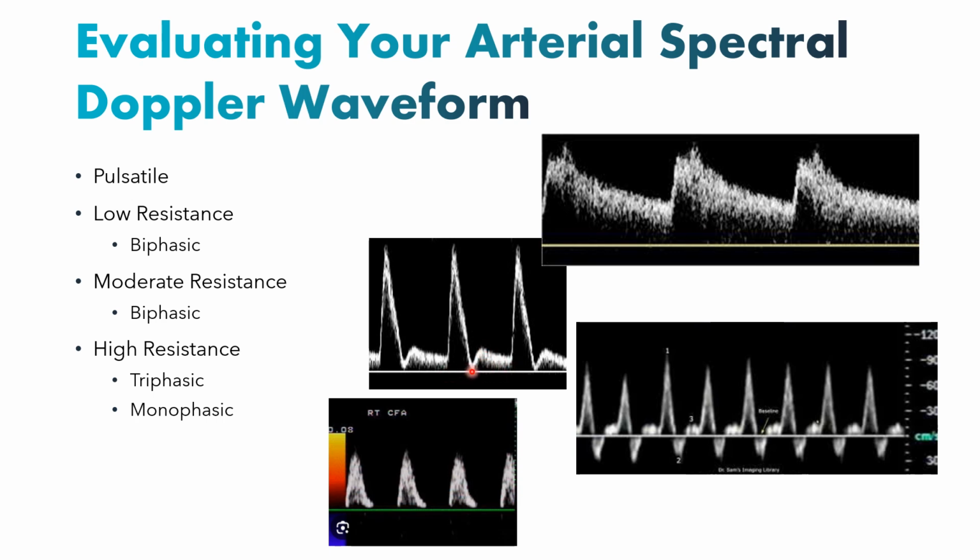So in this case, this would go forward, almost come to a stop, but then have low enough resistance to flow forward all the way through diastole. So this again is biphasic, relatively low resistance flow, and yet it certainly is higher resistant and different than we see here in our very low resistance flow.